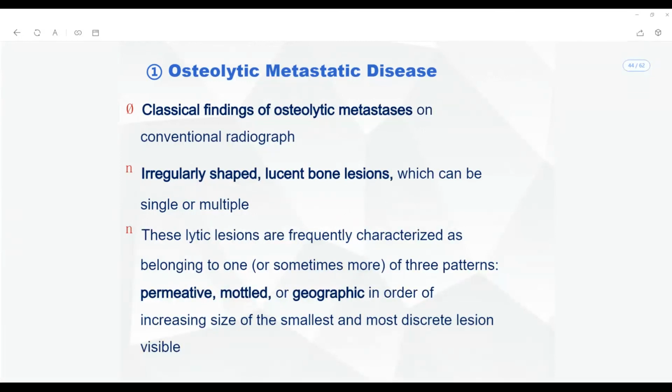But you have to compare it to the multiple myeloma skip lesions. Multiple myeloma skip lesions are lytic lesions where there are hypodense areas and some areas look white, which represent the normal areas. But here, there are also some black areas, but those black areas are normal and all the other white areas look like a hyperosteosclerotic condition, right?